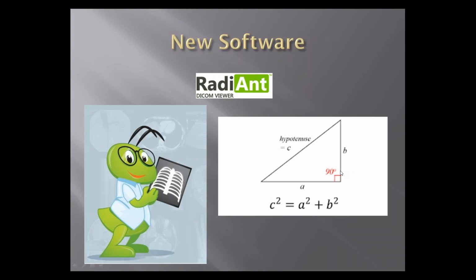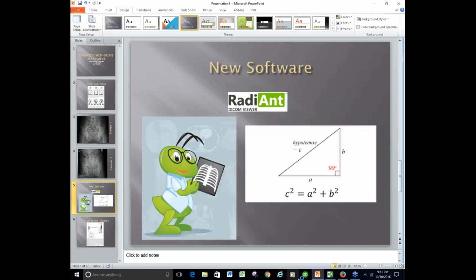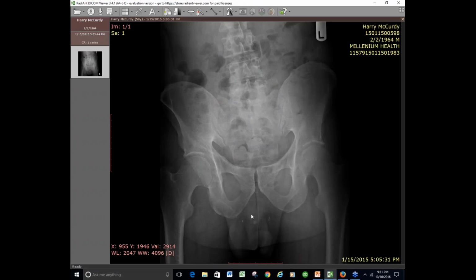And so you're going to have to do a little bit of a calculation if you're doing it on an actual film. If you can get this free online software, which I just happened to stumble upon, if you can get that going, then it's much easier for you to analyze this and do it properly. So what I'm going to do, we're going to jump out of this real quick, and I want to pull up that same guy, our example number 2. There he is. And this is of the actual film.